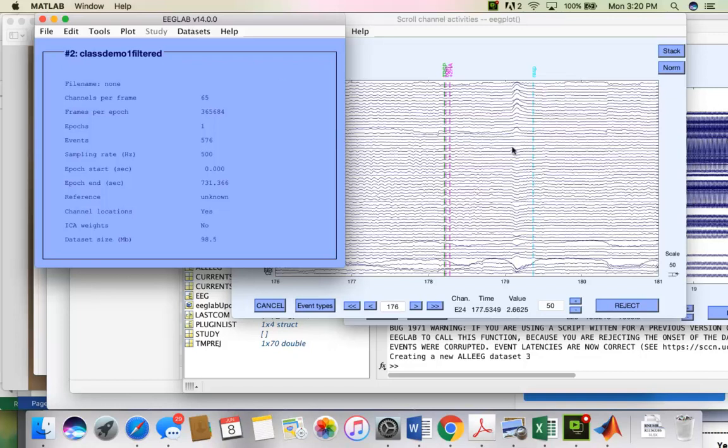Anytime you run this on your full raw data set, it's going to take a while. It's been filtered, but we haven't really done anything to it except filter it. It's a big data set, and the algorithm gets a starting point, an initial condition, and then it's iterative. How many iterations it has to make depends a little bit on the randomized initial condition setting.